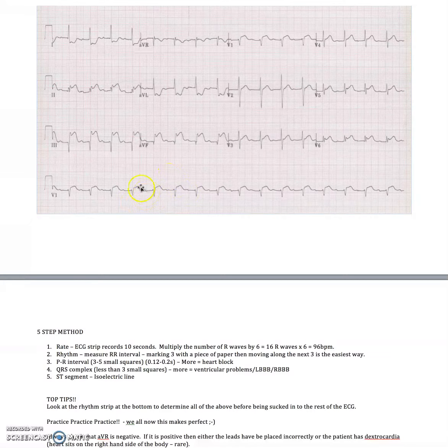All right, now we've established that, we can have a look and we can see that we've got some degree of heart block and we've got a STEMI in this ECG. Now we need to interpret what's going on. This is where we come to all these little bits, all these leads. These are your 12 leads which form up your ECG. Now you need to familiarise yourself with what areas of the heart these leads are referring to. And the only way you're going to do that is with some practice. You need to have a look.